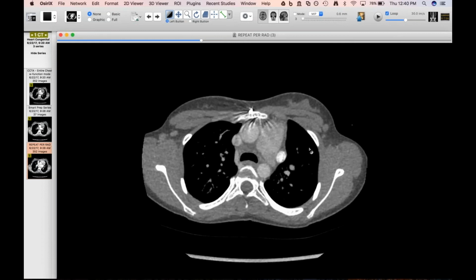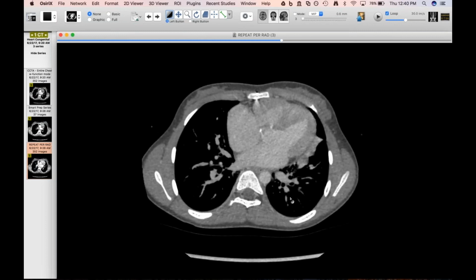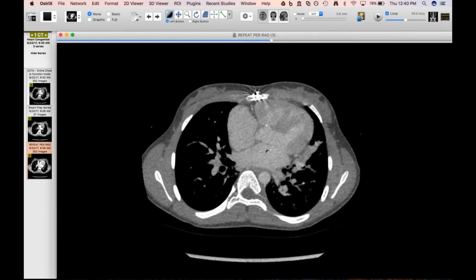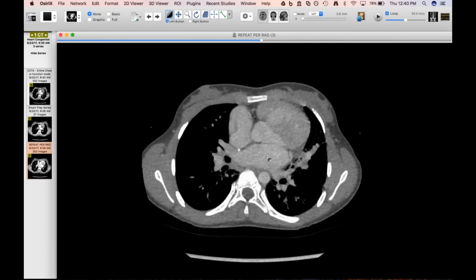So Travis, yeah, there's something called the Raghib syndrome or complex. Right. Combination of left superior vena cava draining into the left atrium, ASD though, and absent coronary sinus. That's that syndrome. This one is a variation on it. This is probably a variation on the Raghib syndrome then, yeah. So, yeah, but does she have, what's that little calcium there? Does she have an ASD?